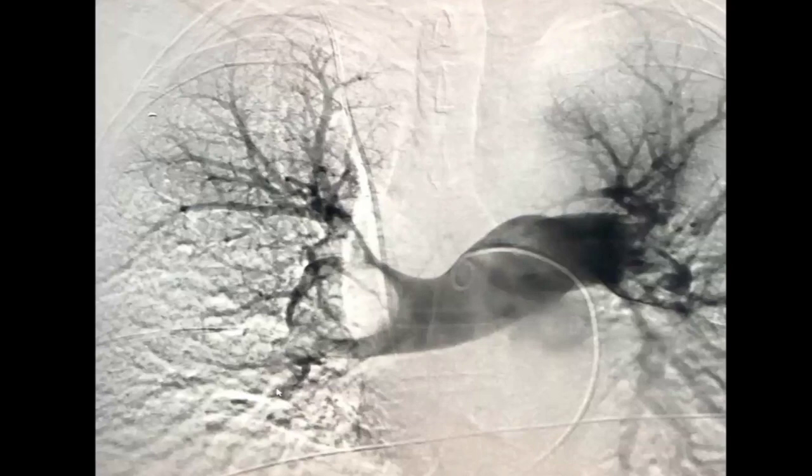I'm not able to make out the main trunk, and that's why I got confused. It's okay. That's why you're here. That's why we're showing you these. Yes. So let me stop. This person has had a pulmonary artery angiogram. Why do you think somebody's having a pulmonary artery angiogram? So to rule out pulmonary embolism. What is the gold standard study for ruling out a pulmonary embolism? CT pulmonary angiogram nowadays.